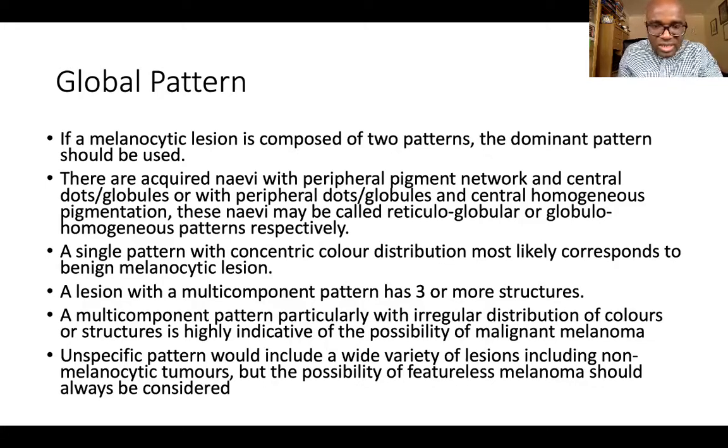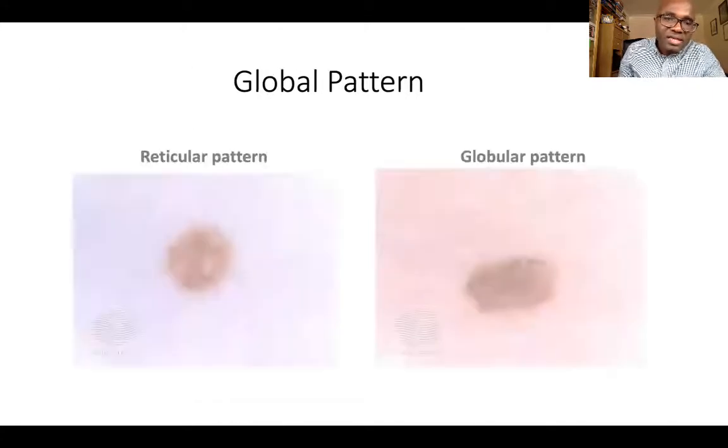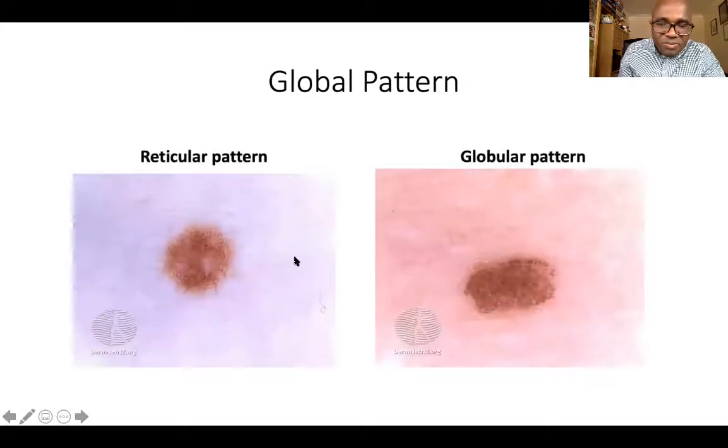Non-melanocytic lesion. If it's featureless, think of melanoma. Okay, that's global pattern. So here are a couple of dermoscopic images of global pattern. This is a reticular pattern, a global feature. You see this is network, generally reticular pattern.